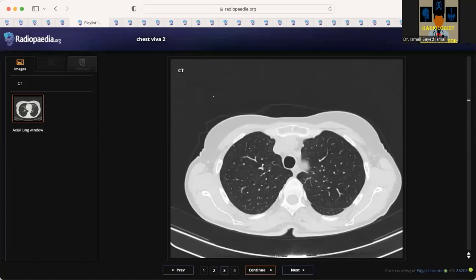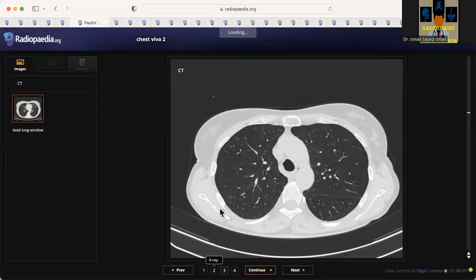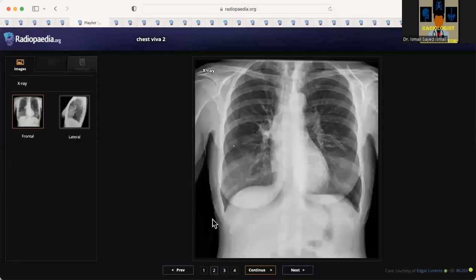Yeah, so well done. You've picked it up nicely. So this is a case of what we call Lady Windermere syndrome, which is caused by Mycobacterium avium, a non-tuberculous mycobacterium. The giveaway was the linear opacities here in the lingula, if you can see just here, perhaps maybe not projecting well. And there are some linear opacities, as you said, in the left lower lobe.